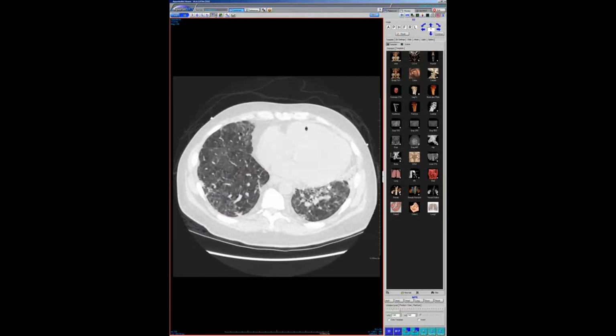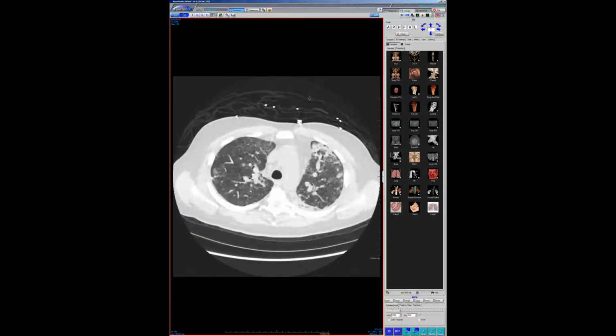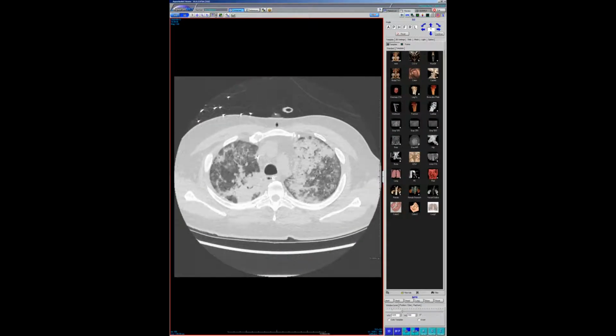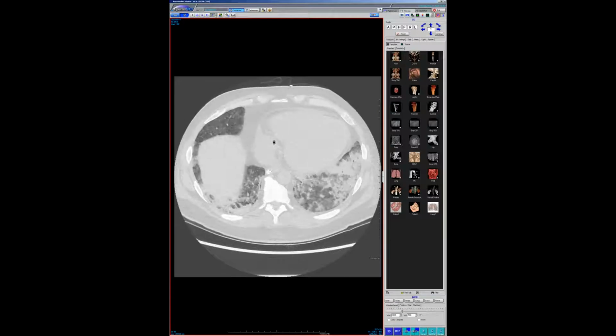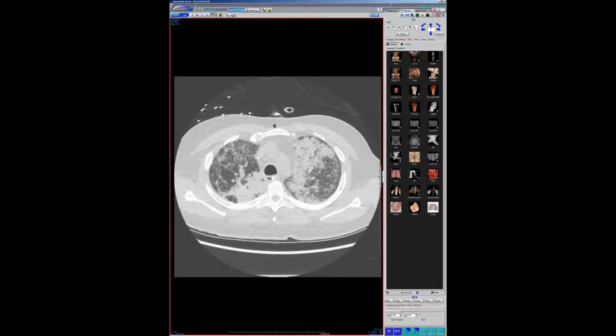Who knows what happens post-COVID in terms of small airway issues, or just from being sick for so long. But the question is, has anyone seen, and they said from the report, it could be endogenous lipoid pneumonia, it could be exogenous lipoid pneumonia. Has anyone seen lipoid pneumonia this extensive and upper lobe predominant? The first question, that extensive, no.